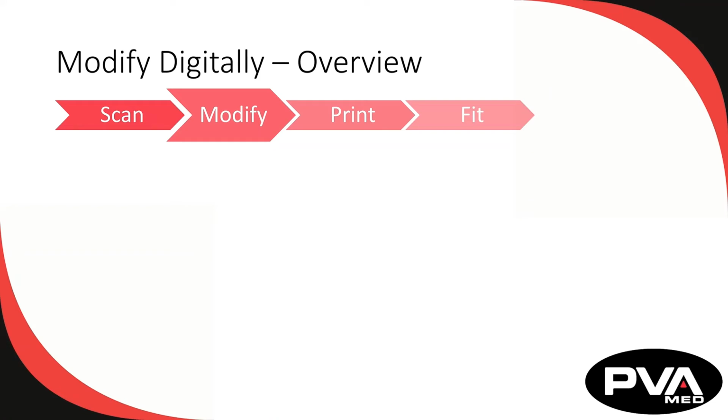Now we will cover an overview of the modify step and the tasks required to complete. The first task is to remove any artifacts that are picked up in your scan. The cleaner the scanning environment, the fewer artifacts that will have to be removed in this step.